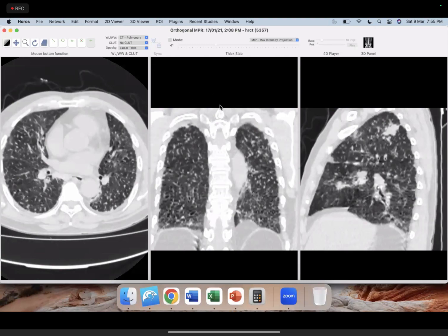Please explain temporal and spatial homogeneity. So temporal homogeneity is when you have the same kind of lesions. The upper and lower lobe lesions are more or less similar in terms of reticular opacities, degree of traction bronchiectasis, whether honeycombing is present or not, ground glass or not, etc. It will not look different. The upper lobes will not show a mild involvement like just some mild reticular opacities with the lower lobe showing extensive reticular opacities, honeycombing, etc. That's not homogeneous. And spatial homogeneity is where you have the upper and lower lobes involved to the same degree. So the mild versus severe doesn't exist.